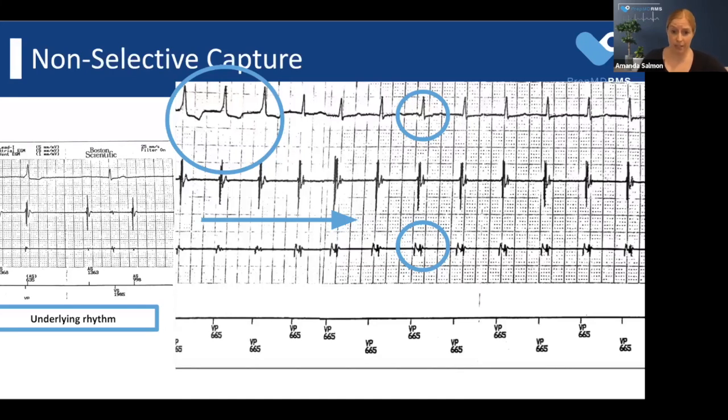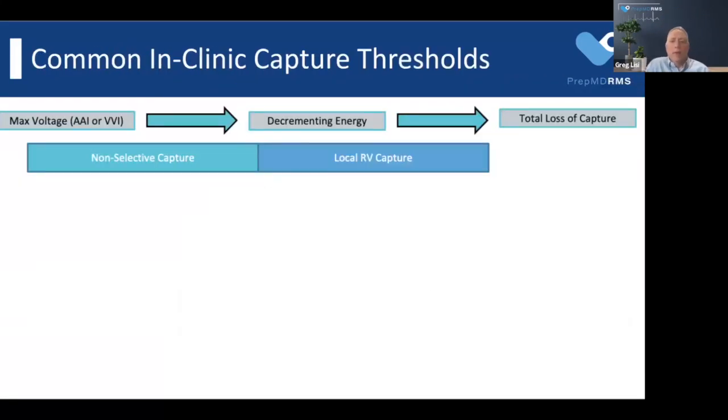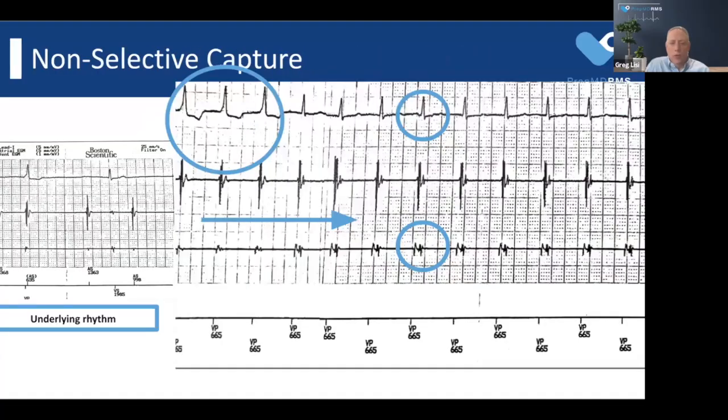There's a couple other things we can note. On our ventricular EGM, or our His EGM, we start to get that deflection of the His signal itself. So here we can confirm we have pure His capture. I think that's a great comparison between the first one and the second one, and you can see the delay between the stim and then the ventricular activation.